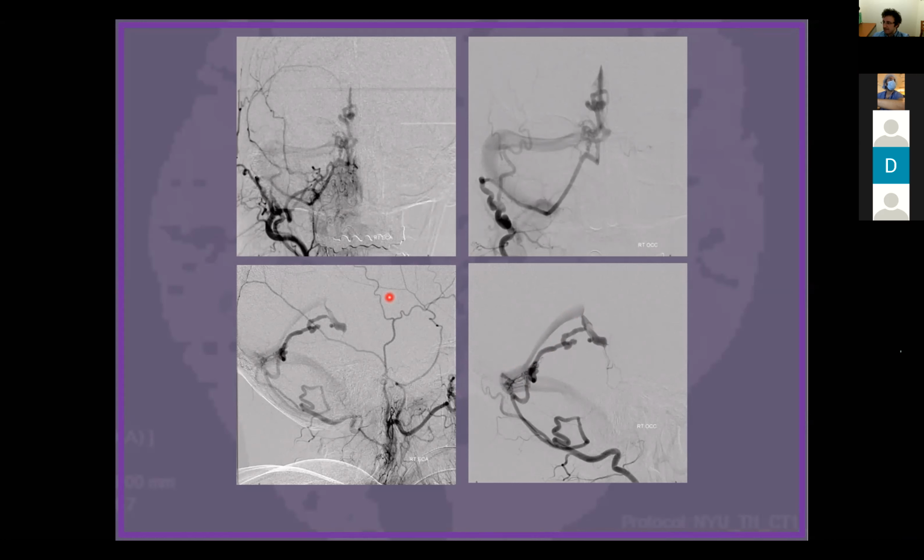We can discuss that, but the most logical explanation, I think, is that this is a tentorial fistula. It's not directly involving the straight sinus or the torcular in this case, and it's draining into this vein. So what is the hemorrhage related to? The hemorrhage is related to the congestion of the superior group and the lack of outflow of the vermian segment and the adjacent structures, because this vein is taken up by the fistula. I think, Eitan, this is your case from years ago.